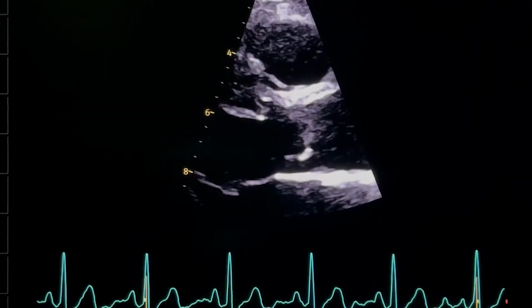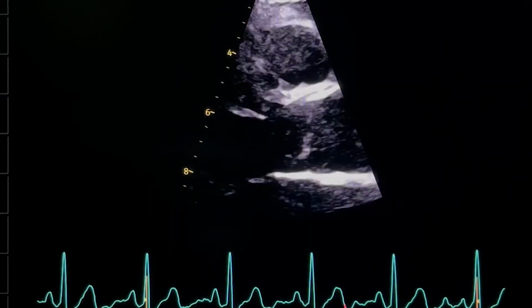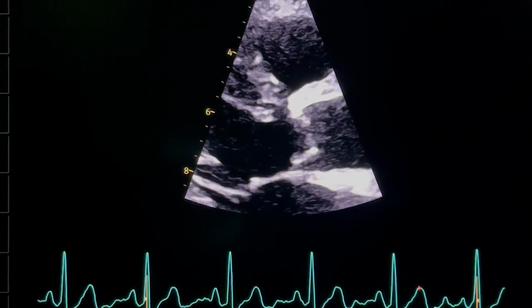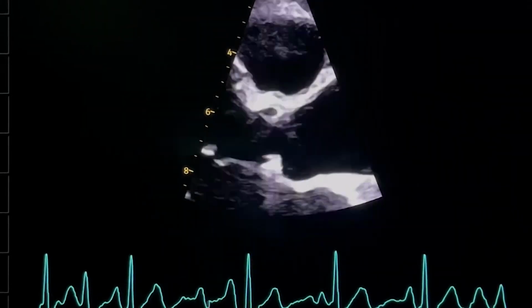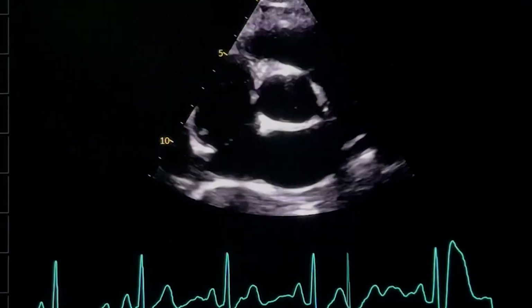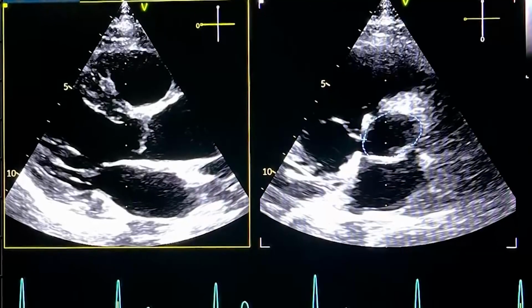Perhaps the most difficult aspect of evaluating the aortic valve area by the continuity equation is assessing the left ventricular outflow tract area. So the recommendations are to measure the LVOT dimension by zooming in into the LVOT and take the measurement just below the aortic valve leaflets and avoid any calcifications. And then this diameter is used to calculate a circle area. However, we know now that the LVOT is usually not a circle but an ellipse with the anteroposterior diameter less than the medial to lateral diameter.